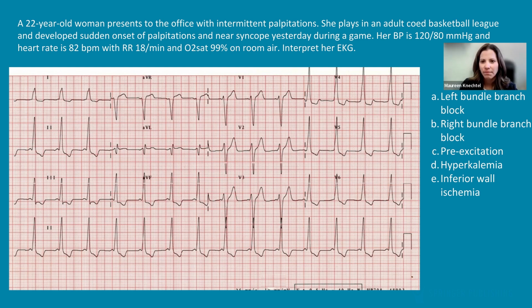That brings to mind something called Brugada pattern. Pre-excitation has got to be up there. A long QT. And then there's other less common things like arrhythmogenic right ventricular dysplasia, hypertrophic cardiomyopathy, other things that you would think about. But pre-excitation, you've got to look at that because an EKG will tell you if that's what's going on.